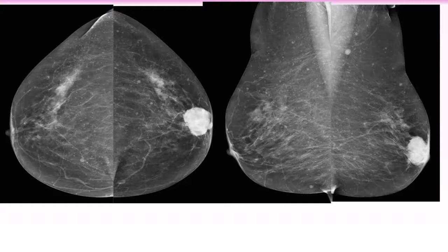I mean regarding the diffuse bilateral dense lesions in the breast, on a background of ductectasia.